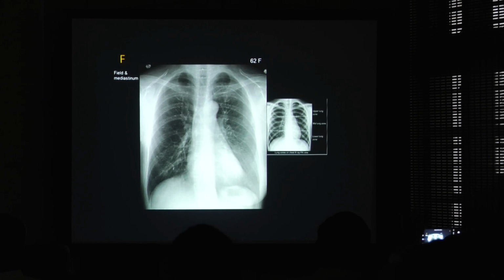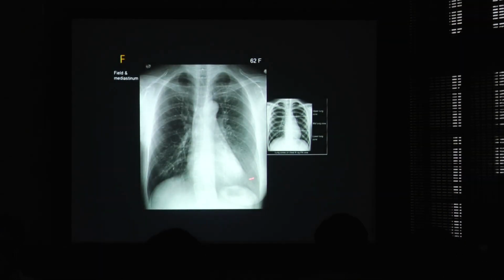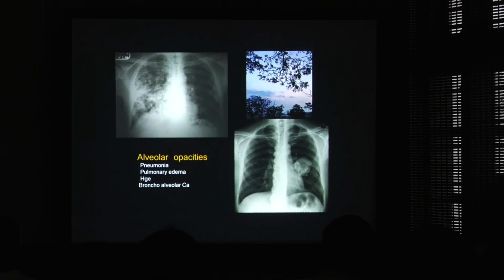If you have followed one of the points I have already raised, you would be able to come to a conclusion. Look, this is a female patient. So here I can see the breast shadow very well. Because of the breast shadow, the lower lung field is a little hazy. And here I cannot see the breast shadow, which makes this lung more transradiant. It's a case of mastectomy for CA breast.